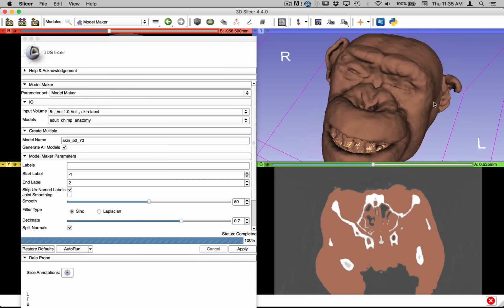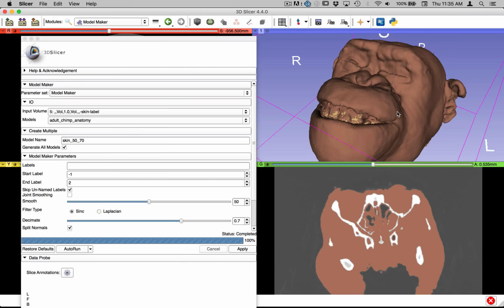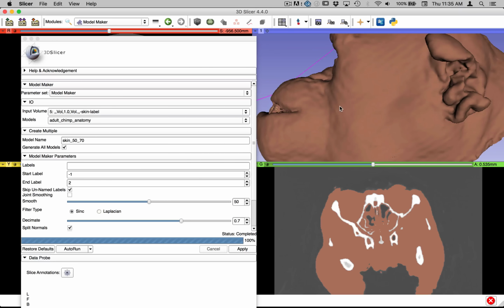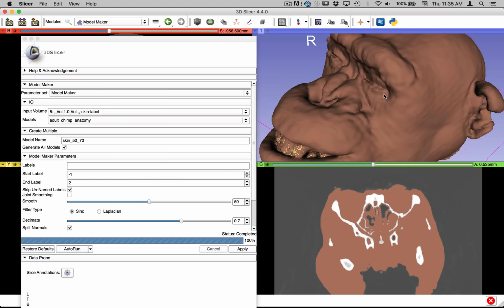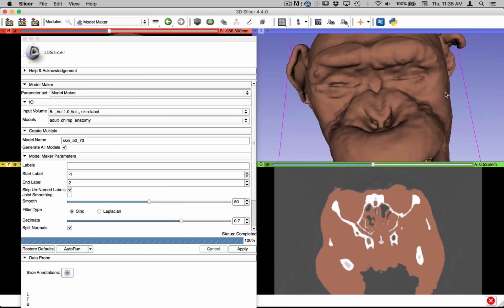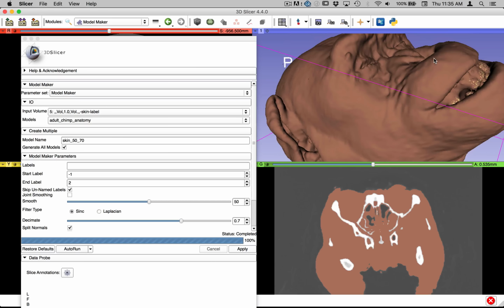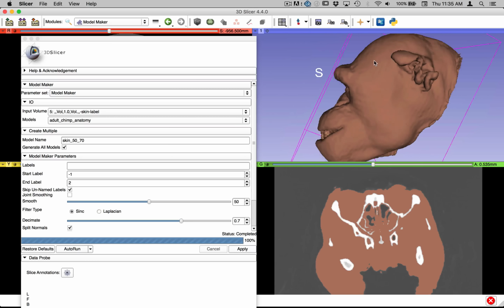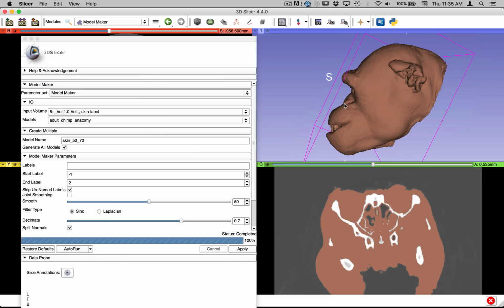So this is a good looking model. You can see that we didn't exclude the part around the teeth here, unfortunately. But for what I'm going to use this for, it's not worth it to me. It's a slightly low resolution model, but there's going to be so much internal structure that it's going to be hard enough for Maya to deal with this that I'm not going to worry about this. Again, this will ultimately just be used as a black silhouette to sit behind our skull render to put it into context. So I'm not going to worry about it too much.